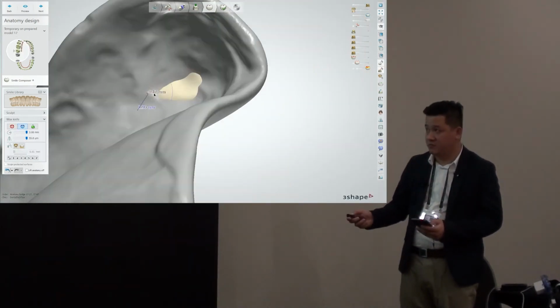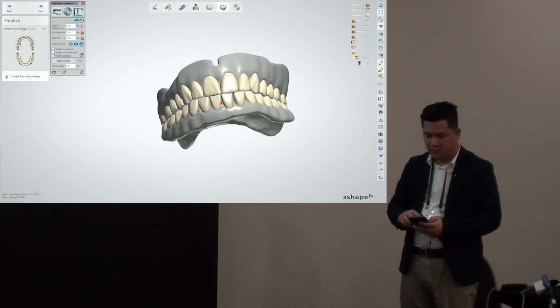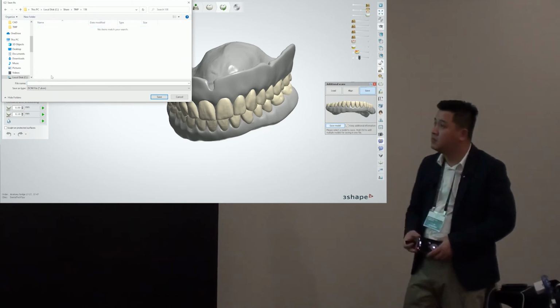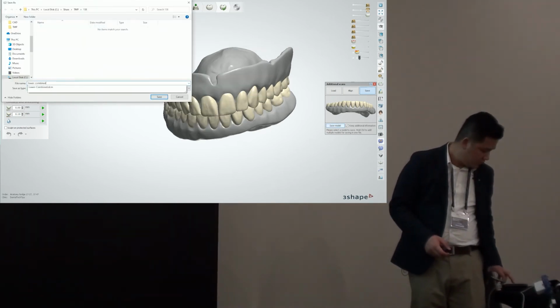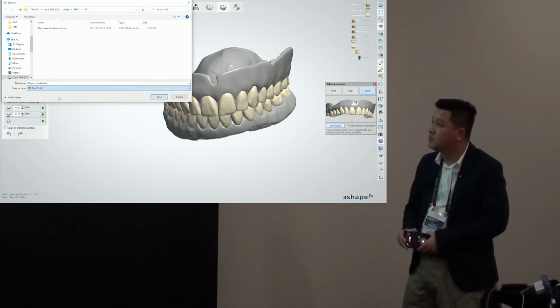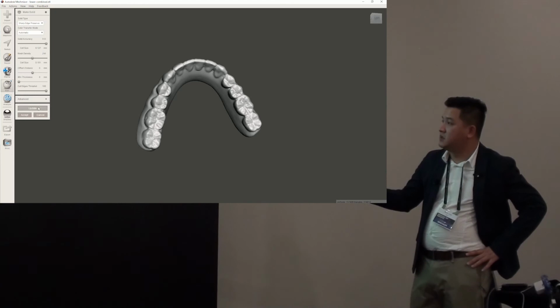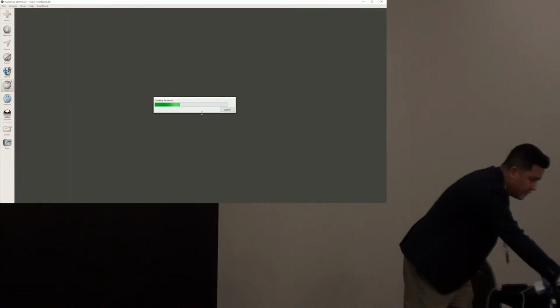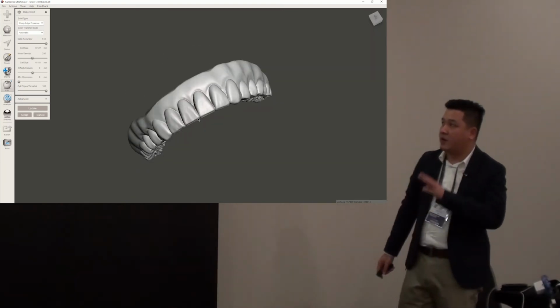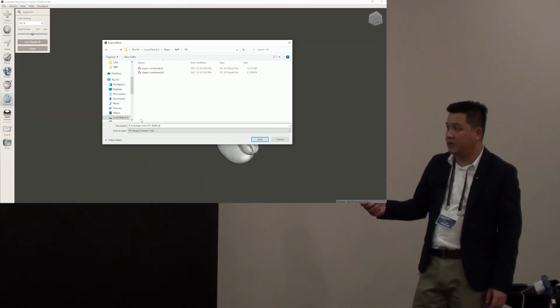You can see here I need to remove these underneath as well. Now what I do is I'll control click, select the files, I'll combine them, and then I'll bring them into Mesh Mixer. And the reason I do this is you want to make sure that they're solid. So you just want to make these objects solid and printable.